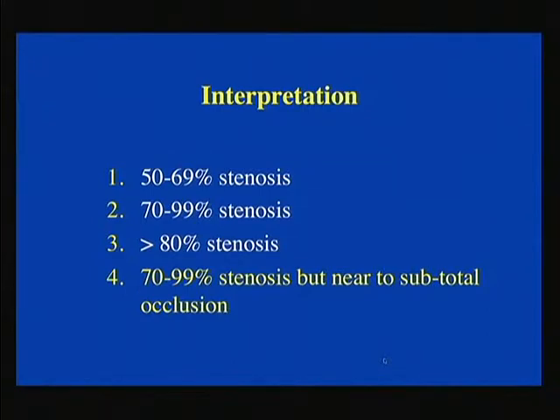What's happening is that we're not up at 500, right? We've gone back down to 300. But in the process of going down, flow through the distal internal carotid artery has gone down. So we're on the other side of the slope where the velocities are dropping. And one of the indices is to look at that internal carotid artery more distally. In fact, it's one of the major reasons to always sample the internal carotid artery. Because when that velocity starts to drop off distally, that means there's not enough pressure to drive the system anymore.